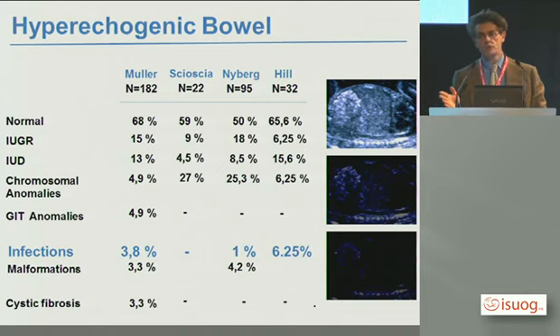Most hyperechogenic bowels are nothing at all, completely normal outcome, whether the fetus has swallowed some particles floating in the amniotic fluid or nothing else. The vast majority will be normal. Dead fetuses often show a hyperechogenic bowel, but this is not a diagnostic challenge. Severe IUGR do the same because of redistribution and hypoperfusion of the bowel.